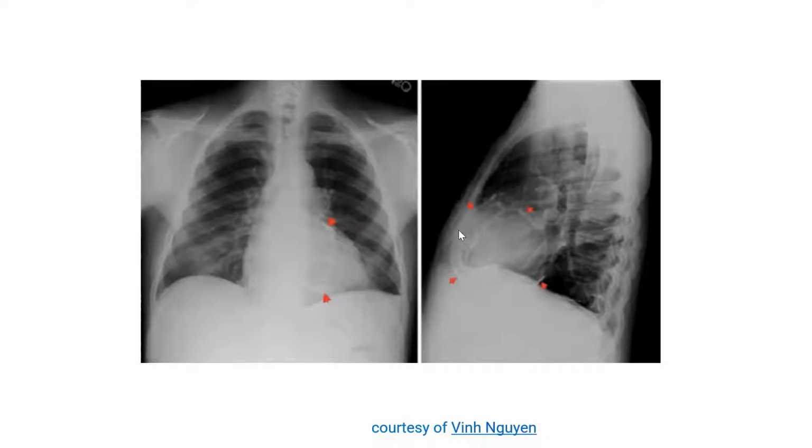You see here how clearly you could see the calcium, where you missed a lot of it here and you see just glimpses. And if you don't focus, you might even have missed it completely. So the lateral, unlikely to miss the calcification, but quite likely to miss calcification by the PA. Okay, so this is a case of pericardial calcification. Let's say you stumbled into this pericardial calcification, reviewing this chest X-ray for some other purpose. What next step are you gonna take? What's your next step?